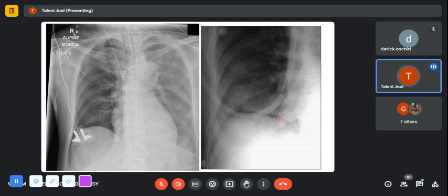And Derek, a Mach band could also look like this, could have this type of appearance in this place as well. So in a well patient, for instance, someone who just came to get a chest x-ray for a medical checkup, otherwise fine, then this would be a Mach band. But in someone who is critically ill, unable to sit, it would be a pneumothorax.